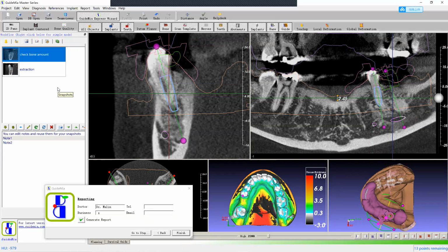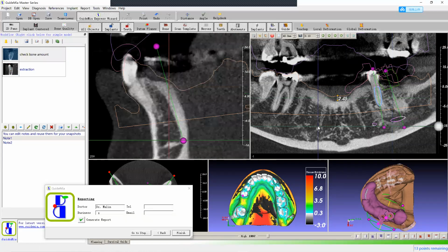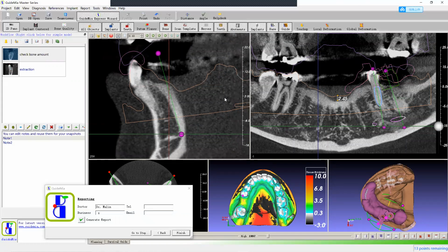Remember I said it's not only a picture, because when we go to somewhere else in this window, or when, for example, we close the project, reopen it, go into the system, and I say, hey, Dr. Fleming, here's my treatment plan. I want to show you what I do and what's the reason we're doing that.